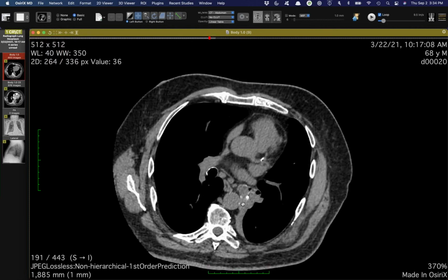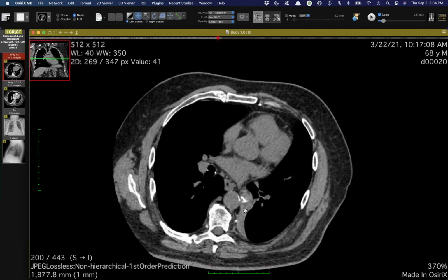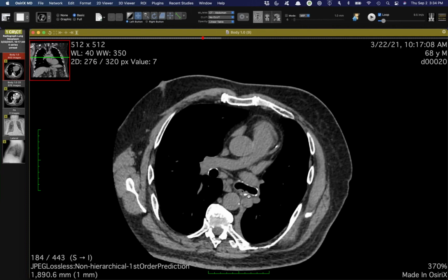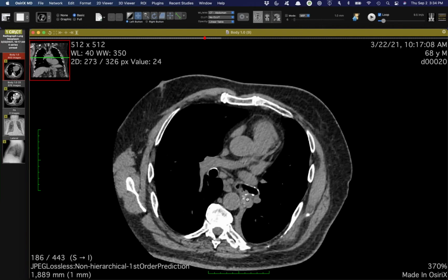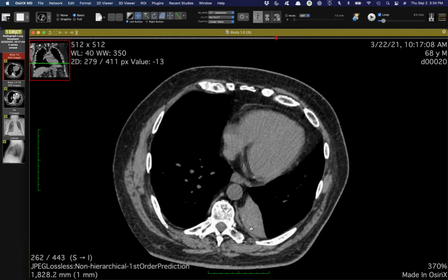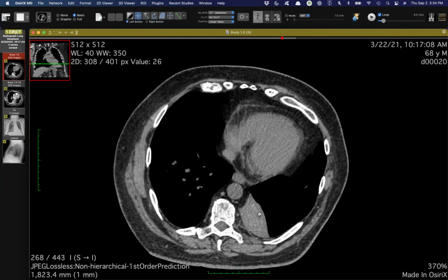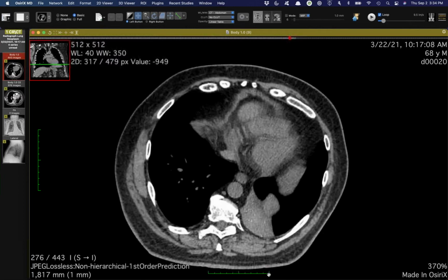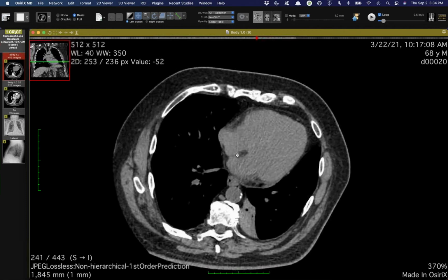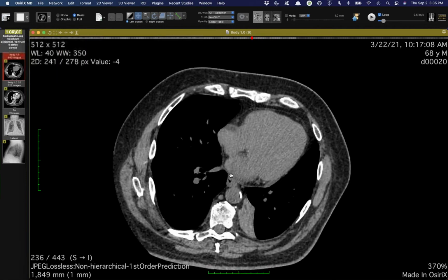But this was a carcinoid tumor in here. This is all some dystrophic calcification. I don't know how much of this is tumor, maybe a little bit of adjacent mucus or secretions, but they've debulked it some, and you can just see this must be there for I don't know how long, but just chronic collapse of the left lower lobe and a lot of volume loss. Just a really good example of left lower lobe collapse on a radiograph.